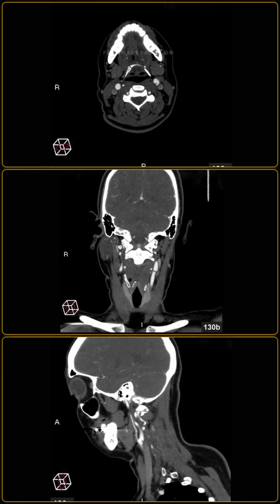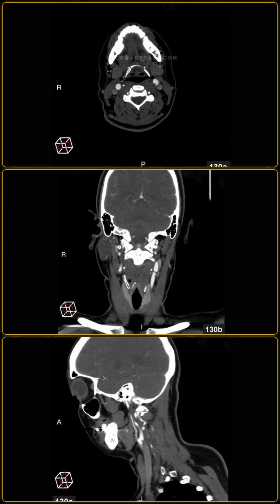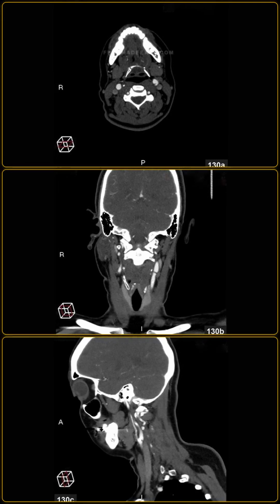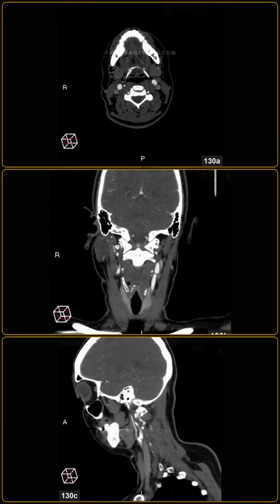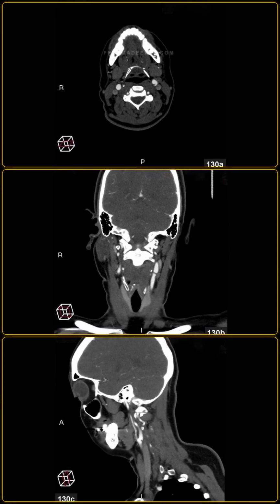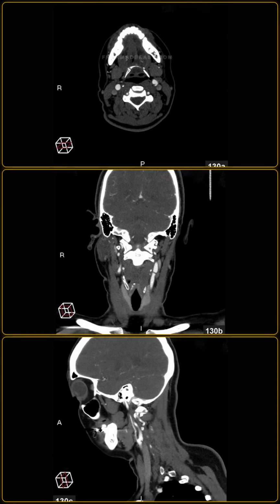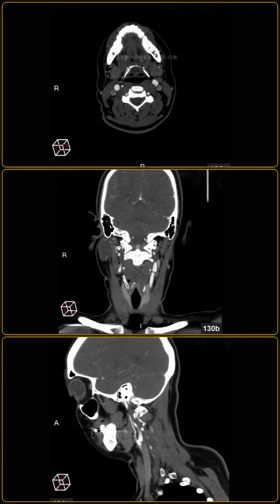Why are carotid webs often missed, and what is the role of digital subtraction angiography? Carotid webs are notoriously difficult to appreciate on standard axial imaging because they are thin and run parallel to the axial plane. They are much better identified on high-resolution sagittal and coronal multiplanar reformats, which highlight the shelf-like structure.